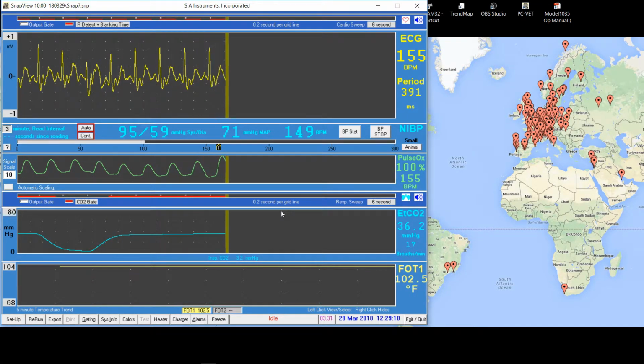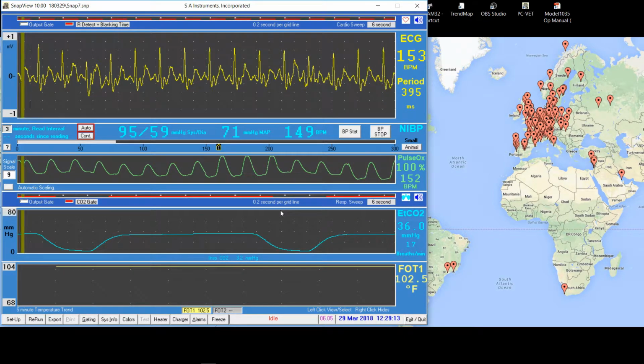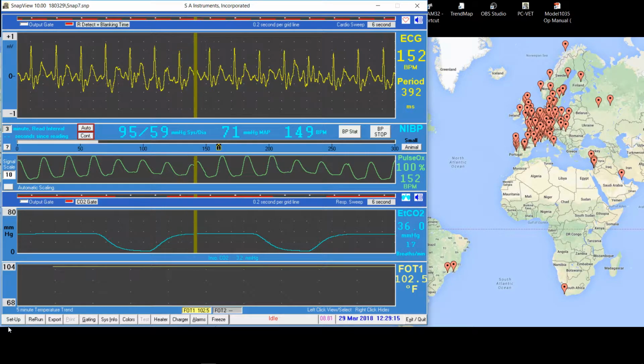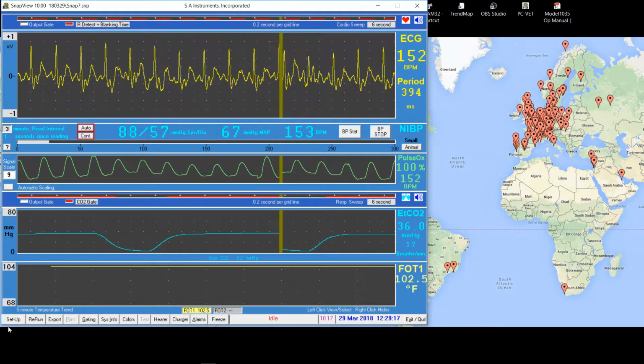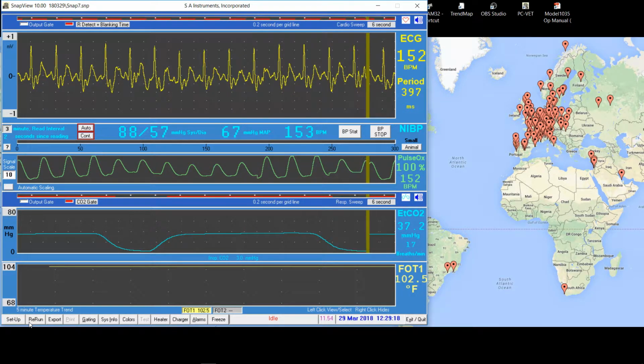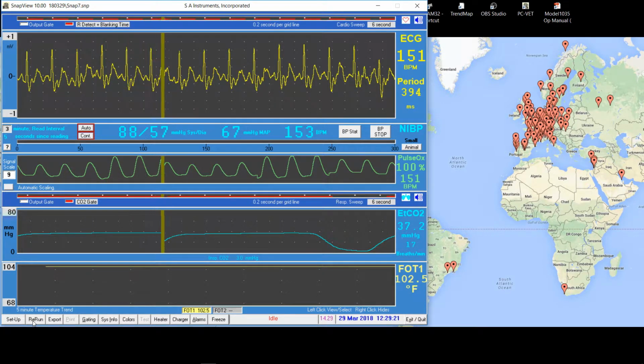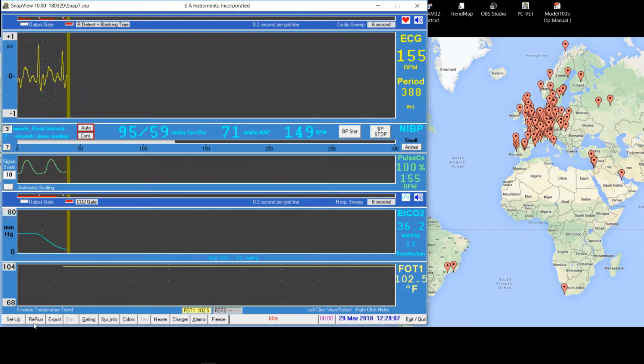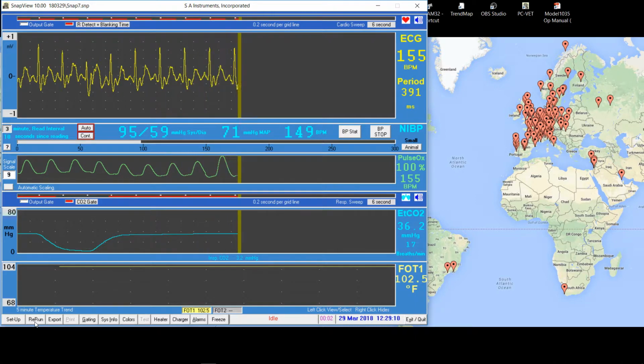The display presentation is very much like that of PCVet, with just a few exceptions. One difference are the two keys in the lower left. In PCVet, they were snapshot and trend. Here they're setup and rerun. We only have 36 seconds of data, but by right-clicking on the rerun key, playback will automatically restart after 36 seconds.